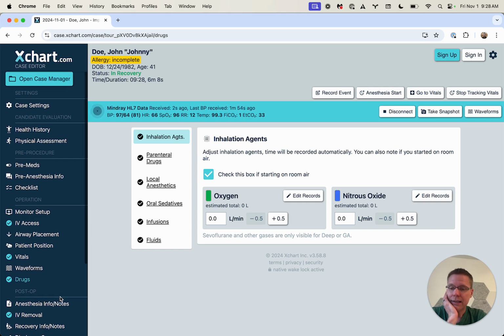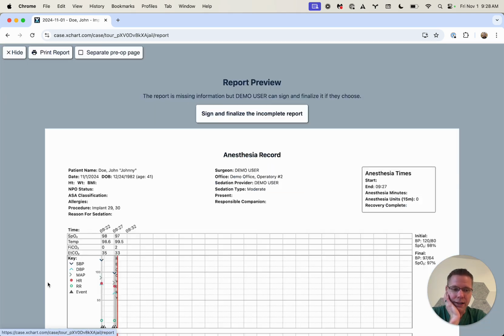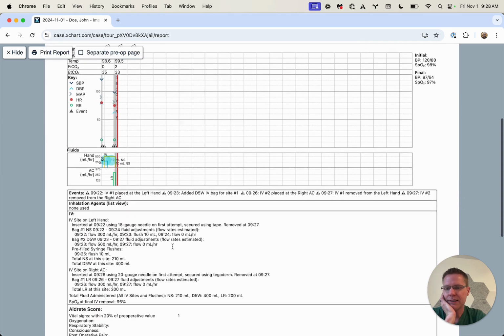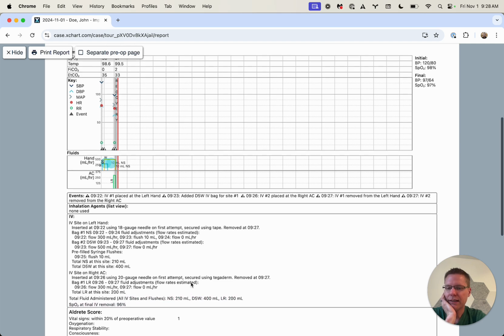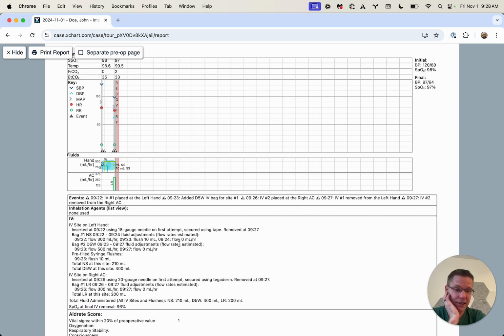So in this way, you can, if you want, optionally add a lot of detail about your IV setup for a given case. It records it all for you, records final SpO2, all that kind of thing in a nice, concise yet very detailed mechanism, and it draws these nice graphs for you just like it does for infusion.